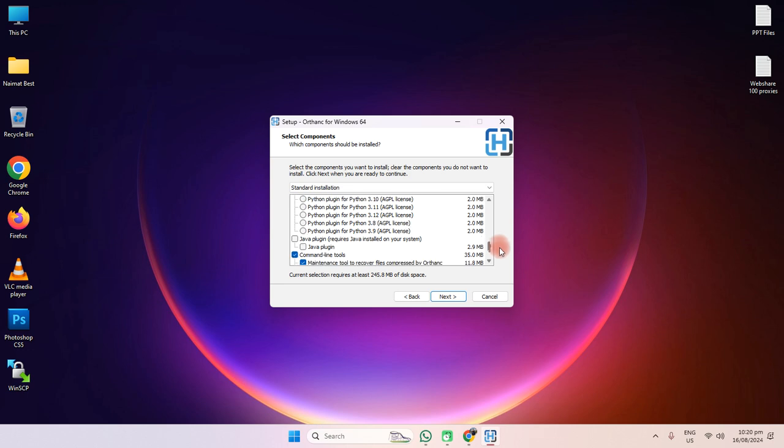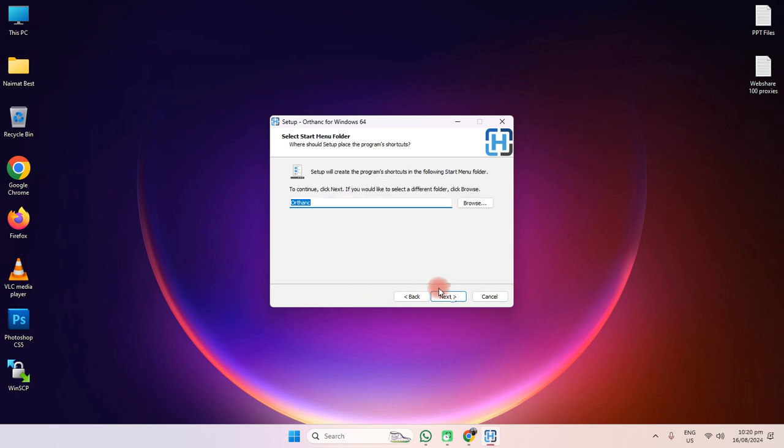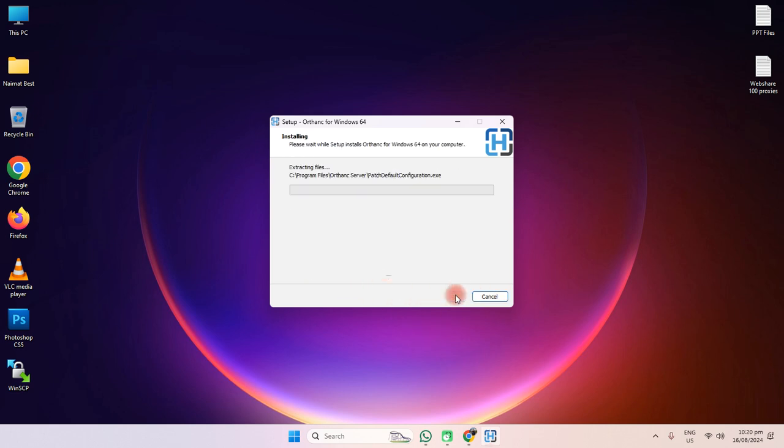So everything which is required for Orthanc and the viewer is installed in this. So click next, next, and install. Wait for it to finish installing.